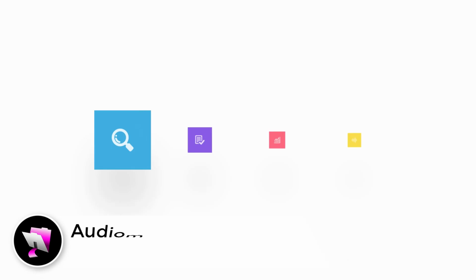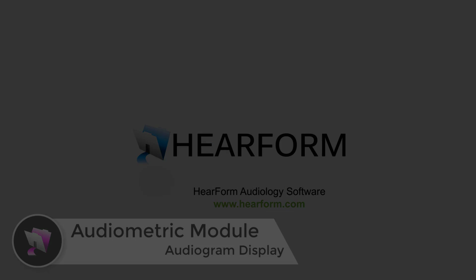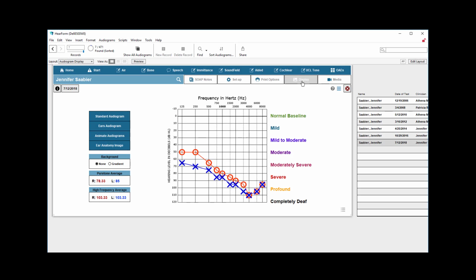Welcome back. This video will explain the Audiogram Display area in HearForm Pro. Let's head over to the display screen. The display screen is designed as a tool for you to use for educational or counseling purposes. If a patient can see your monitor, then you may want to use this larger screen format to be able to show them their hearing loss.